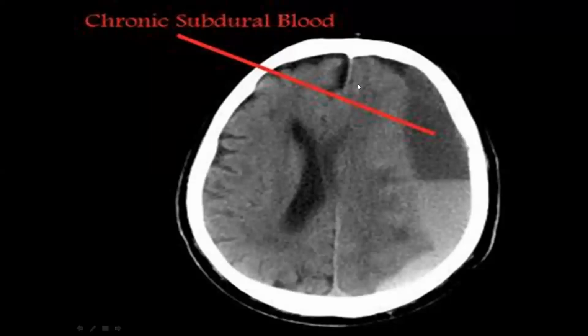So you need to already start suspecting that there might be a subacute hematoma here. Then chronic subdural hematoma. Remember we said chronic is going to appear dark, right? So this is chronic. However, if you look at this, it appears lighter, and in places it gets similar to brain matter. So there is the possibility that this is an acute or subacute bleed, and then this was the chronic blood. Because of the bleed, you're able to notice that the ventricles have shifted to the opposite side.